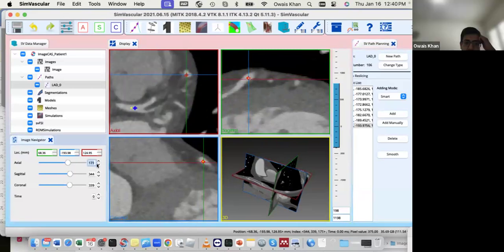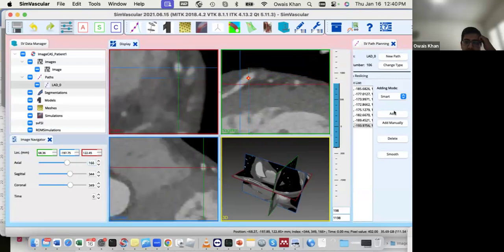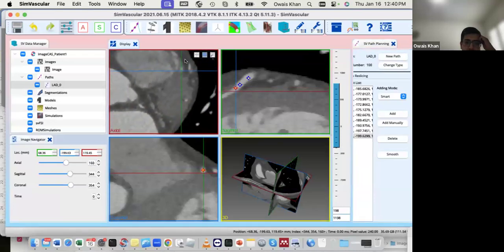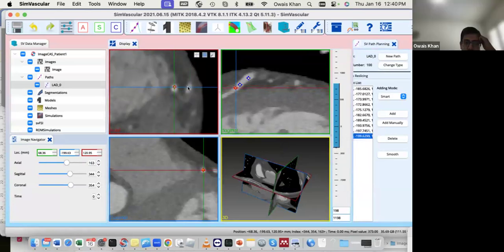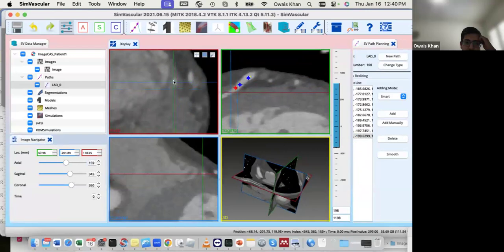I'm gonna keep going, and you can already see another branch coming. Also, this is a smaller branch. We're gonna come back to it later on, but I'm gonna follow the main branch. The main branch is the brighter and thicker one. I'm gonna keep following. Hopefully this is the main branch. Sometimes I can't even figure it out. Anna, I think this should be the main branch. Which one? This one? No, the one that you selected. Yeah, this is the main branch. This should be it. So you keep coming.